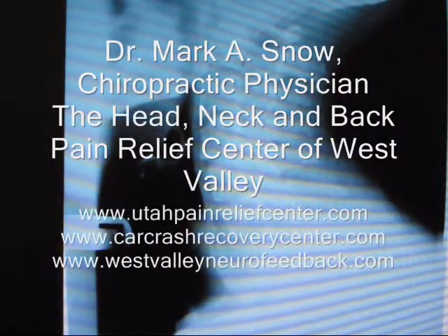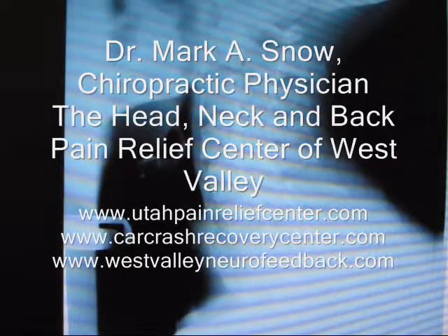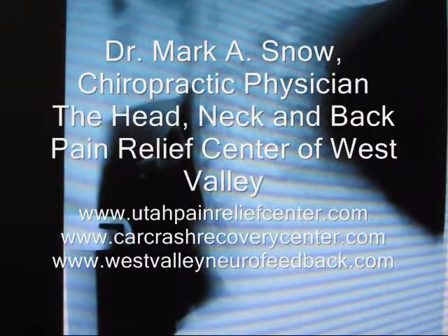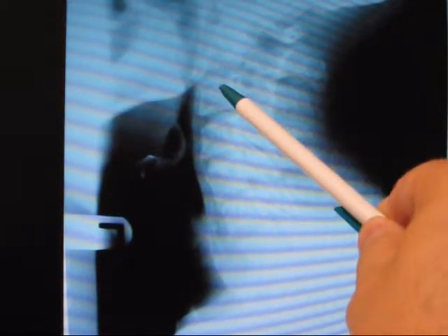Alright, so what we're going to do is talk about the proper structure of the cervical spine or the neck. So we're looking at an x-ray here and we see this is the jaw, this is the back of the head, these are the bones that make up the spine, and these dark spaces, these are the discs in between the bones. What I want you to notice, now there are some problems in this cervical spine, but we're looking at this curvature here. What I want you to notice is this forward curve. Now that is the normal structure of the cervical spine.